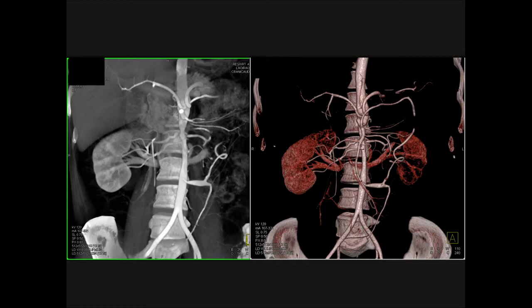Now, aneurysms is good for Ehlers-Danlos, but not the stricture, and mid-aortic syndrome is something to consider, but would not explain the IMA and renal artery findings. And Williams syndrome is not going to be, that's usually supravalvular aortic stenosis. You can get narrowing of the aorta, but the key diagnosis in this case is neurofibromatosis.